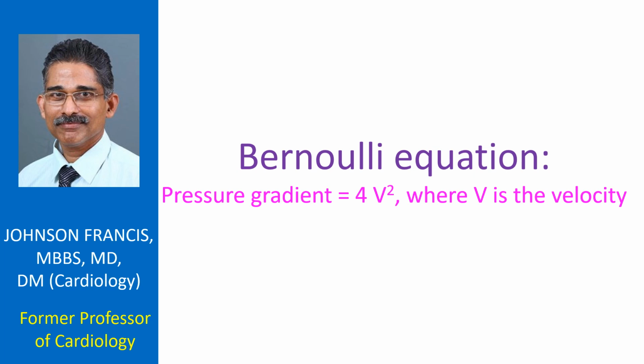A limitation of assessing the severity by gradient alone is that the gradient may be falsely low when the left ventricle fails and is unable to generate adequate pressures. This can be seen in the Doppler tracing as a less steep slope of the tracing from the base to the peak. The ventricular dP/dt can be estimated from this slope. The steeper the slope, the higher the ventricular dP/dt, which is an important measure of the contractile state of the left ventricle.